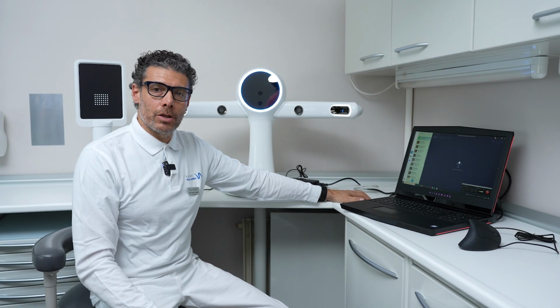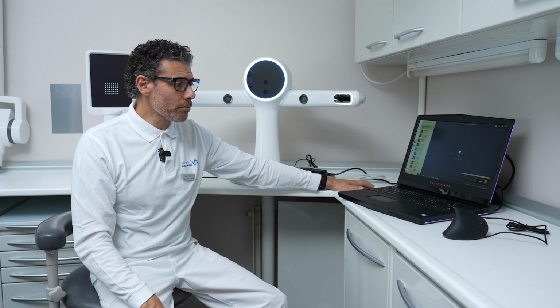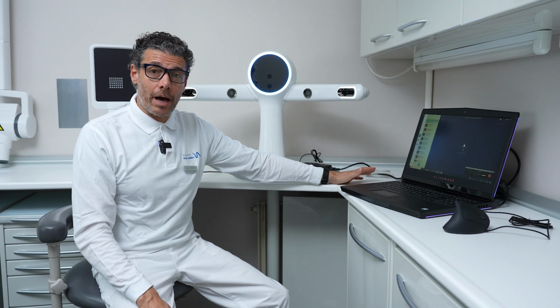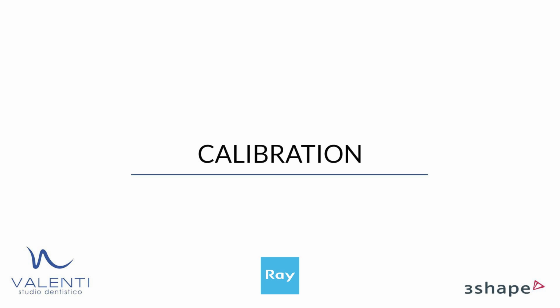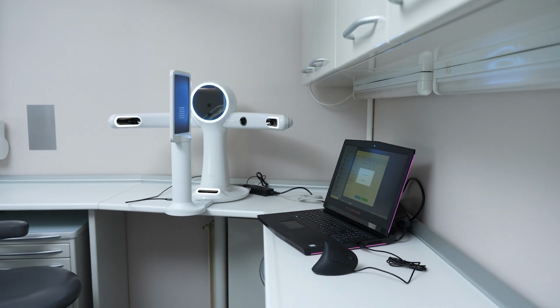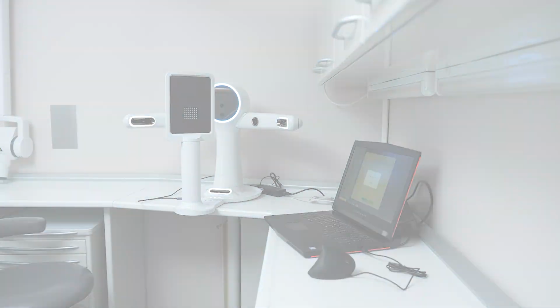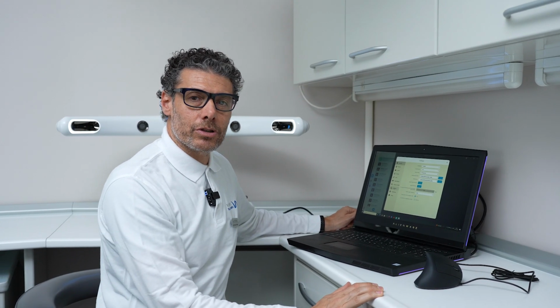We enter our patient data whose intraoral scans we have within the software of the RayFace, and if necessary, we calibrate the face scanner. I entered the calibration system in the scanner. We have calibrated the facial scanner.